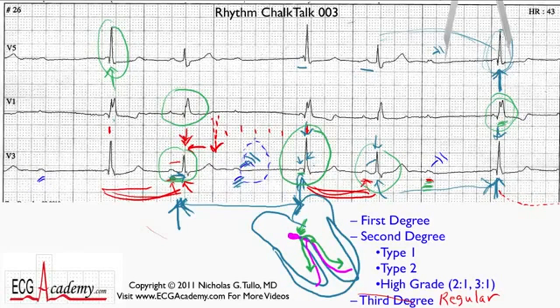It's pretty complicated, but I hope you'll at least take away some important lessons in how to approach this kind of very complicated ECG and how ECG experts will use the physiology to figure out exactly what's going on. So that's Rhythm Chalk Talk number 3. I hope that helps a little bit.